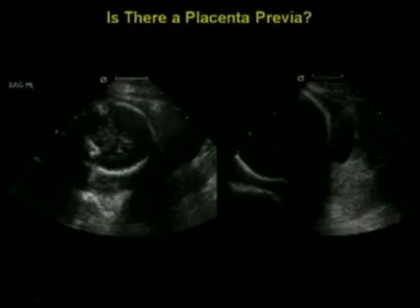So what can we do if the head shadows out the cervix? Well, here you can see two images, two different pregnancies, two different fetuses. In both cases, the head shadows out at least part of the cervix. Here, these are transabdominal views. There's the fetal head, casts a shadow down here. The cervix would be somewhere around here. We have no idea from this image whether there's a previa or not.